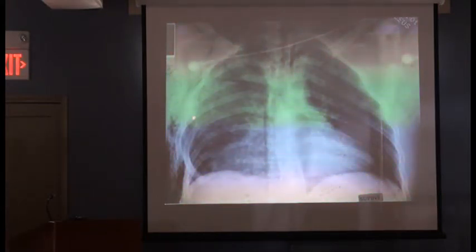You see these? These are posterior rib fractures. Now, Joel, did you say pulmonary contusion? All right. Now, why is this lighter than here? Because this lung is in fact contused. And you see how it's brighter? It's not brighter all over the place. This lung is actually pretty much normal aeration, right? This is the normal side. See, it's about the same color.